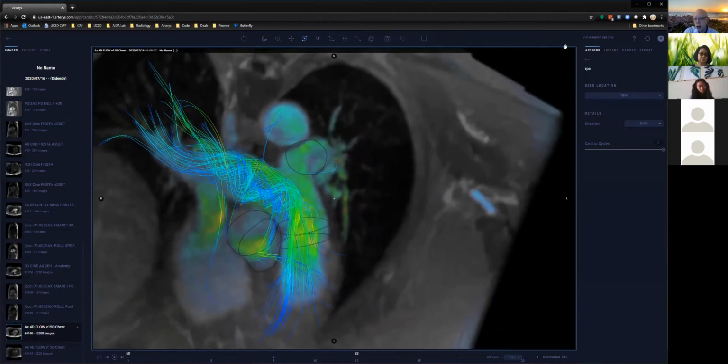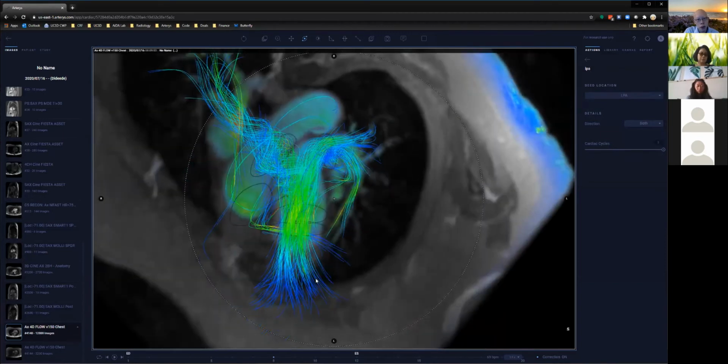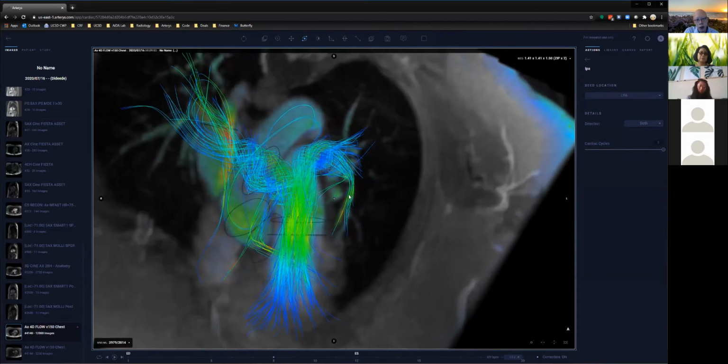The left side is also complicated here. So that's another reason to bring this up. And I'll just send those streamlines both forward and backwards. But it's maybe not as bad, actually. It's quite straight.